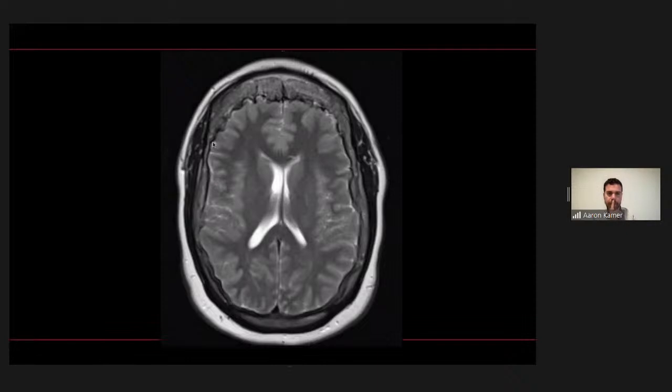All right. And actually, let me point out, especially for people who aren't used to looking as often at MRI or haven't looked at as many, where we're even talking about the calvarium. Remember, the outer layer of brightness on a fat-bright sequence is usually the scalp. We'll usually see a dark layer of outer cortex of the skull, the outer table, and then we'll see the fatty marrow. And then usually a slightly thinner inner cortex of the skull. So this whole area right in here is all marrow, much thicker, like Dan pointed out. And this whole area right here is thicker than normal. The squamous portion of the temporal bone is supposed to be fairly thin. So we're seeing a much thicker calvarium than we expect.